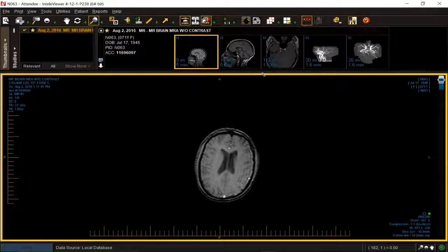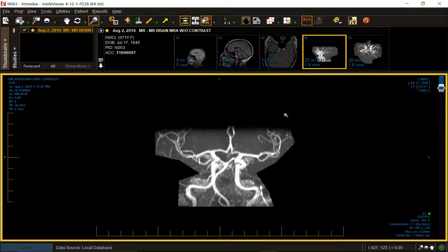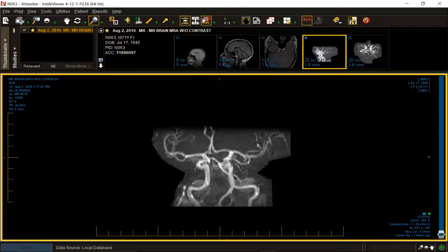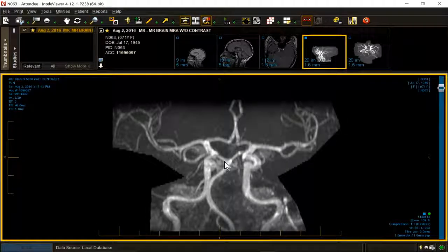This one's more simple. I would suggest you go to the fourth set of images, the MRA, and scroll. Now, there's a method to my madness here. I don't think the MRA MIP information is all that informative.